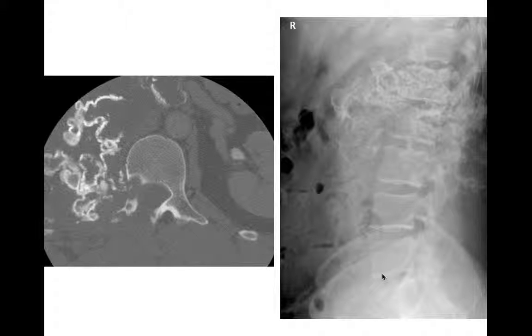This was a chondrosarcoma occurring off the vertebral body. This was a patient who also had multiple hereditary exostosis, and this one underwent malignant degeneration. So this started off as an osteochondroma arising from the vertebral body or the rib. It's not exactly clear now where it came from, just because it's so effusive.